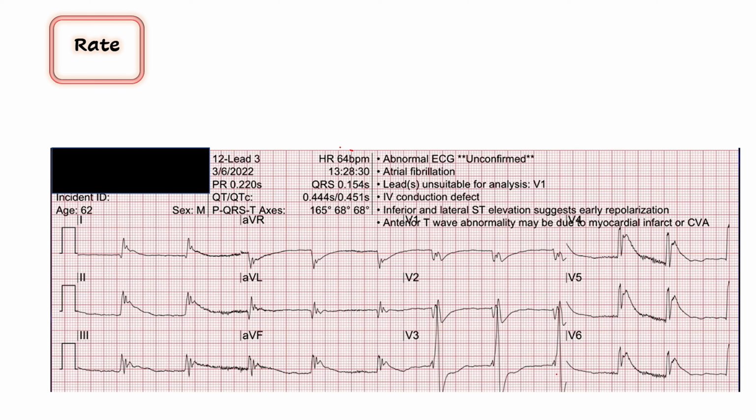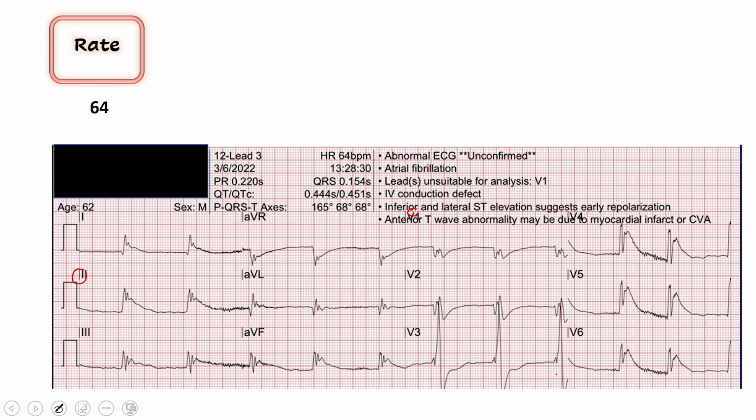We move on to our rhythm. So two questions here. Is there a P wave before every QRS, and is this a regular rhythm? Looks pretty regular to me. I'll give him credit for that. In terms of P waves, I'm just not seeing them. I typically look in lead 2. Sometimes you can look up in V1. There's some baseline artifact here, but I would actually think due to his core temperature, that might be shivering. You could maybe call it a subtle or slow atrial fibrillation, but this is not a sinus rhythm.